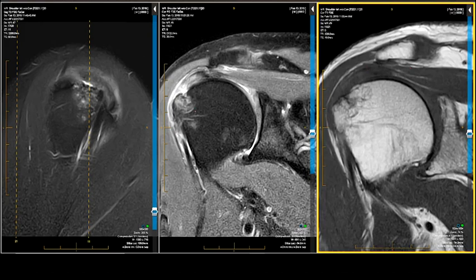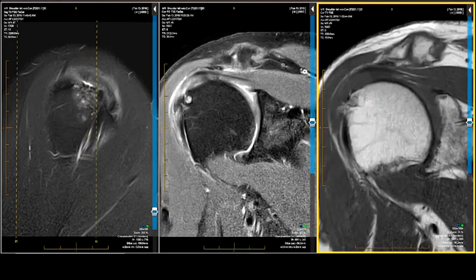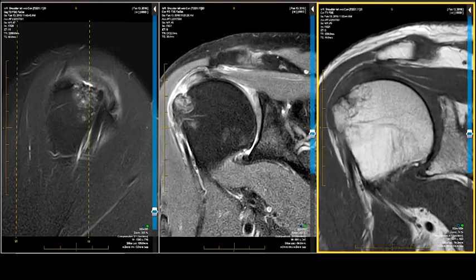You want to leave them alone and let the rotator cuff just scar down. Now, this is a 70-year-old. He's skiing. Should we fix this? And my answer is, yeah, I think this is a candidate even though he's 70. If he's otherwise healthy, this is really inflamed, lots of bursitis.